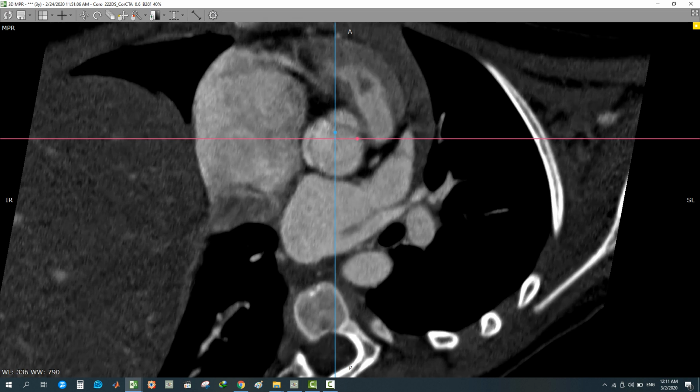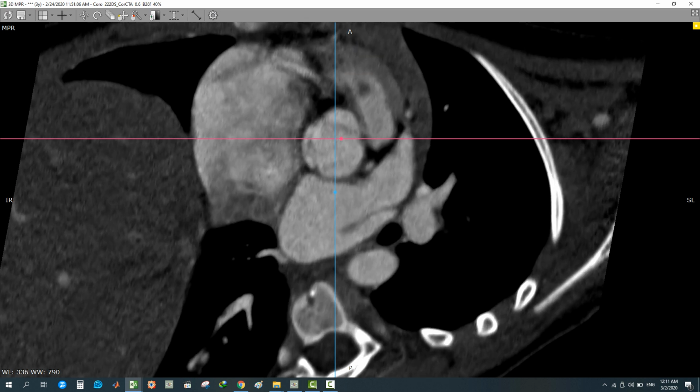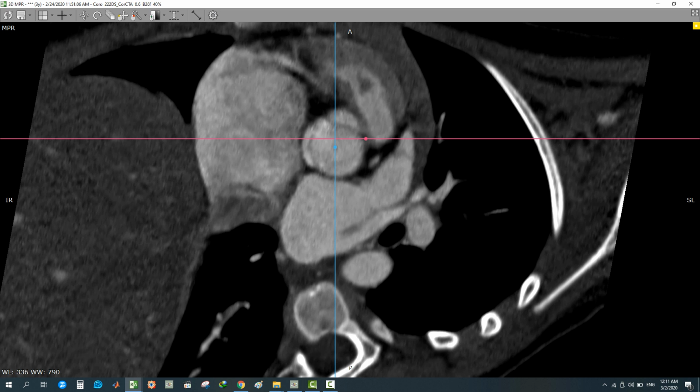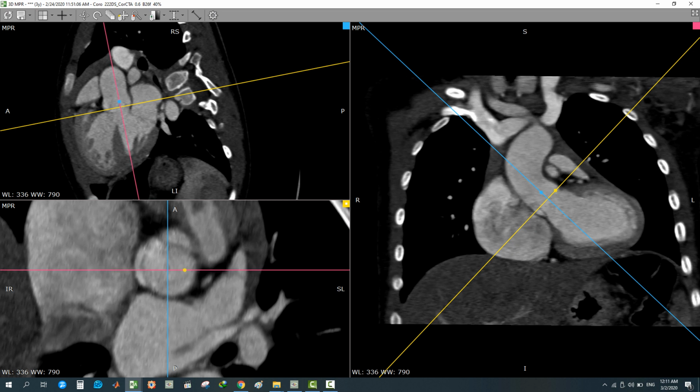Okay, tri-leaflet aortic valve in systole. This systole is 40% of the cardiac cycle. Systole. Okay, leaflet, and leaflet, this tri-leaflet aortic valve. Okay, you can easily scroll in the coronal to exclude subaortic membranes, supravalvular aortic stenosis.